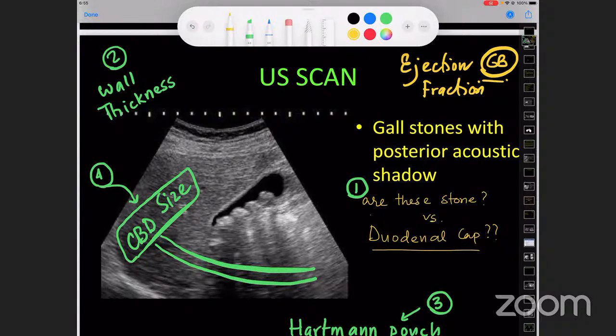Ultrasonography is a very good modality to evaluate the gallbladder, and part of the extrahepatic and intrahepatic bile ductal system. And as told earlier, in the double pipe, one is the CBD and one is the portal vein. To see the CBD, it's not necessary to do an MRI scan or MRCP. Ultrasonography is a pretty good modality to see the distal end of the CBD itself. If the patient is in a proper bowel fasting state and has proper bowel clearance, then we can see the CBD on ultrasonography as well.